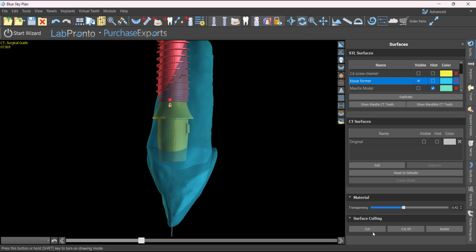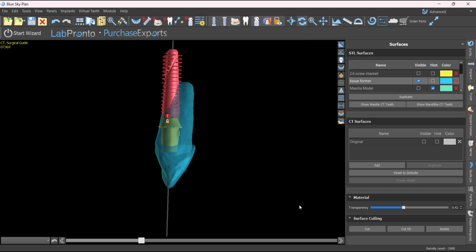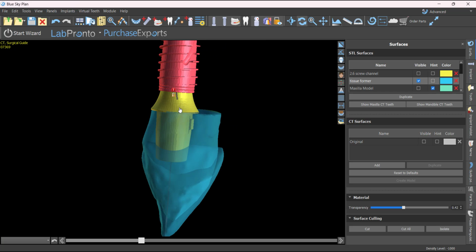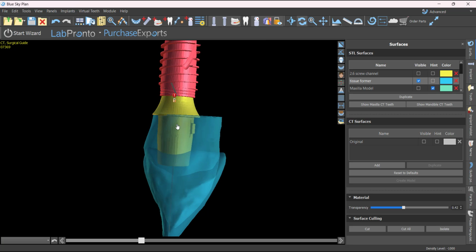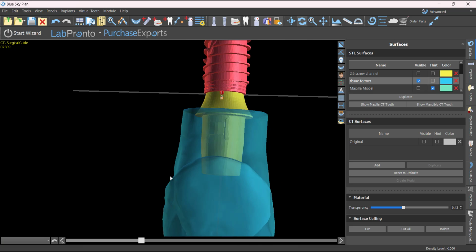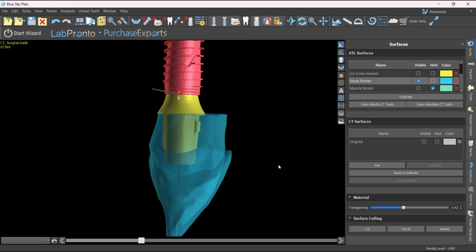If you just want to do something kind of quick and dirty, you could just come up here and use your cut tool, all right, and just make a cut across here, all right, and now you've got this shape. If we just Boolean subtracted this tie base from it and the screw channel, then you could print this object. And all you would need to do, I mean, you'll clearly be able to see where the margin emerges to the tie base, is just taper down this little bit of area right here so that you don't have an immediate ledge out to it. Make a smooth flowing contour down to this. All right, so that's one option.